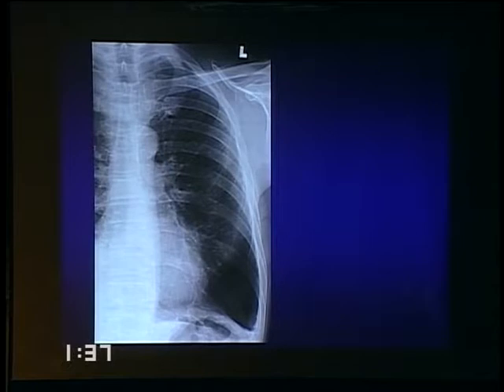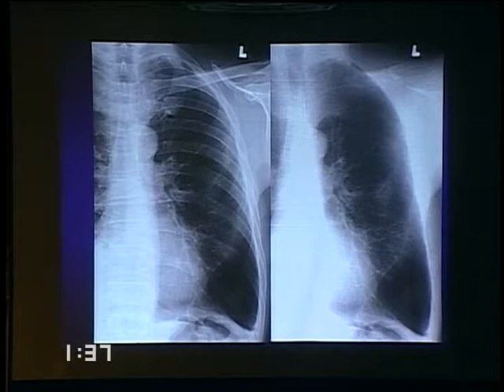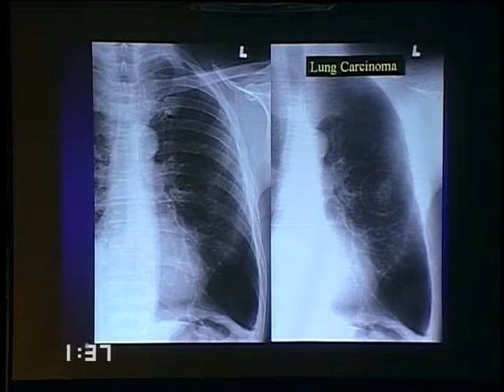Let me show you an example of how this can be useful in clinical practice. Here's a patient, and I'm directing your attention to this lung with symptoms of a possible primary lung carcinoma. Several people looked at this image and overlooked the finding, but actually there is something here in the mid-lung which becomes extremely obvious on the soft tissue image when we take the bones out. So merely removing the bones makes the finding more conspicuous by just simplifying the background and reducing the so-called structured noise in the image.